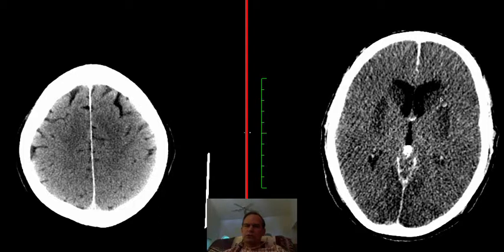Now, the basal ganglia are particularly prone to anoxic injury, and that's why they usually stand out from the background, as you see here with the caudate nuclei on both sides and the putamen on both sides, caudate and putamen, both showing very low attenuation. Here you can see the internal capsule defined by the caudate putamen, and globus pallidus is in here, and it's probably partly affected. It's difficult to separate from the putamen, but here it looks like there is still some intact globus pallidus, but it's a little hard to tell.